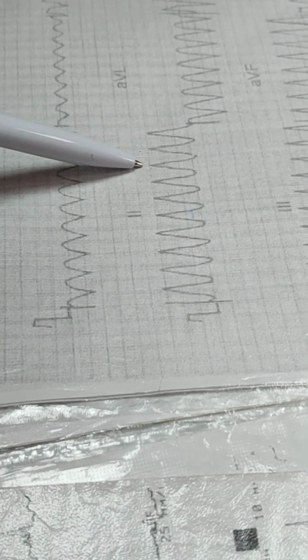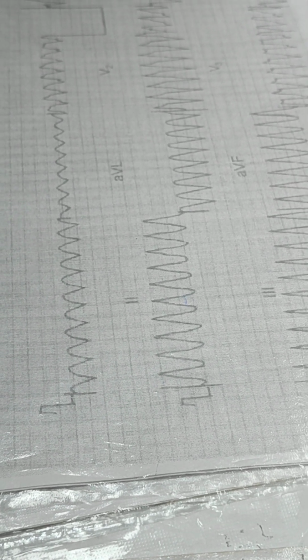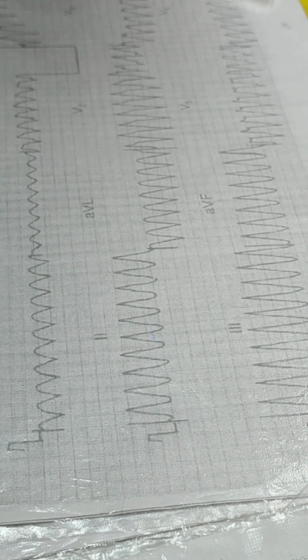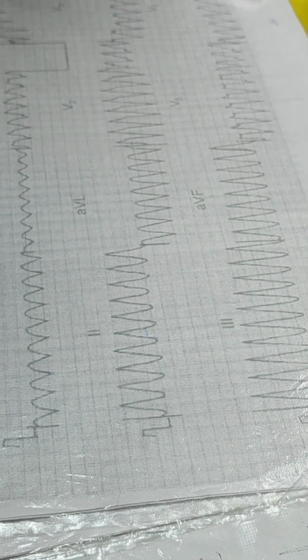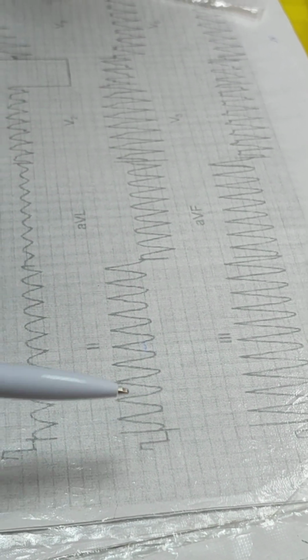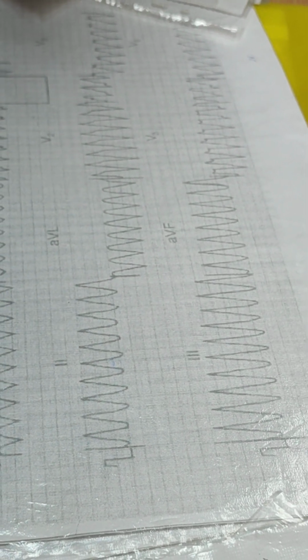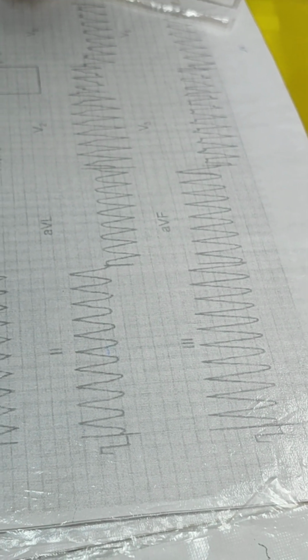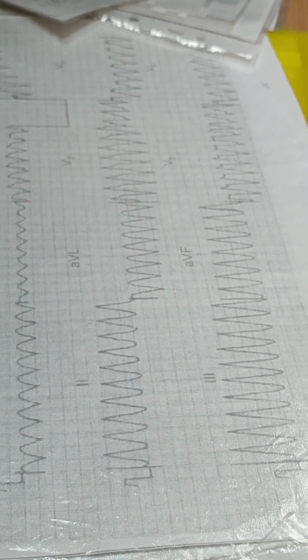This one? Why irregular? Regular. Distances are the same. They are F waves. They look like sinusoid, yeah? P waves are absent, non-sinus. Is there tachycardia or not? Yes. There is tachycardia. Tachycardia is non-sinus. Complex is wide, deformed. What kind of tachycardia? Ventricular. What do we need to do?